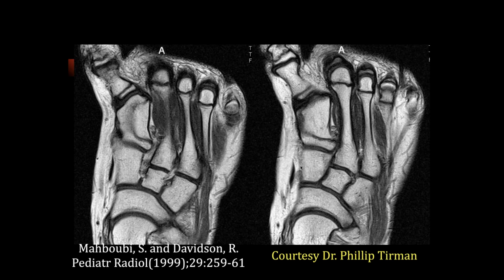Ashu, what do you think of this case? Okay, so we have two coronal views. There's definitely thickening of that and shortening of that first metatarsal. These aren't coronal. Oh, sorry, axials. Oh, man. So there is thickening and shortening of that first metatarsal.